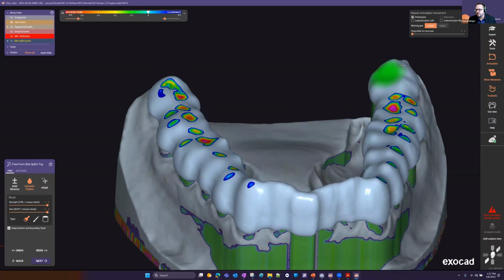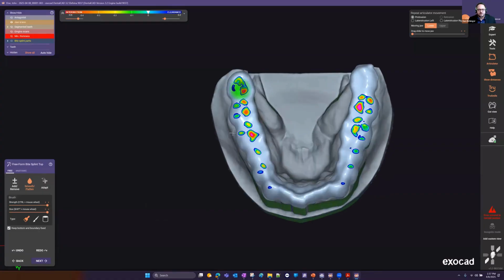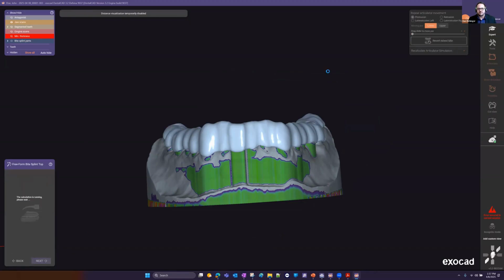And in the previous step, there is a smoothing setting that you can adjust if you don't really want an intimate projection between the teeth. So if you crank up the smoothing factor when it generates the actual splint, you'll have that ability. So again, adapt. Static will just be your relation in Z height, and your dynamic is going to take into effect that simulated jaw movements.